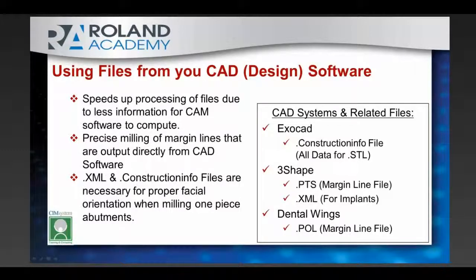But the more important part is you're getting the precise placement of that margin. As some of you may know as well, you also have some milling operations that concentrate on the margin. This is where it comes into extra importance, because you want the tool to travel right along the margin. You don't want it skipping back and forth over the interior and exterior portion where you could cause chips in the milling. So those are the primary importance behind those extra files.